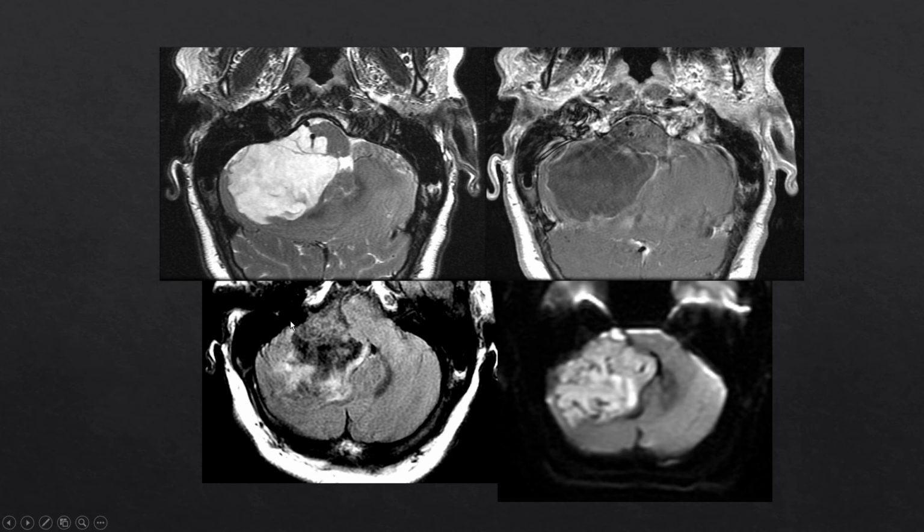And the mass does not demonstrate complete CSF signal suppression on the FLAIR sequence. There are dark areas that do suppress on FLAIR, but plenty of areas of intermediate signal and elevated signal that do not suppress. This mass also demonstrates restricted diffusion and is characteristic of an epidermoid.